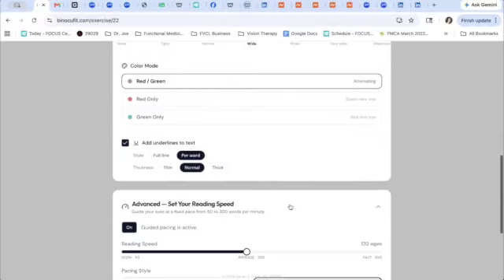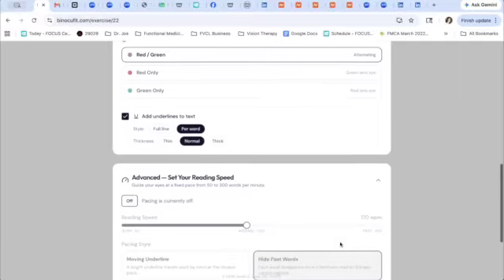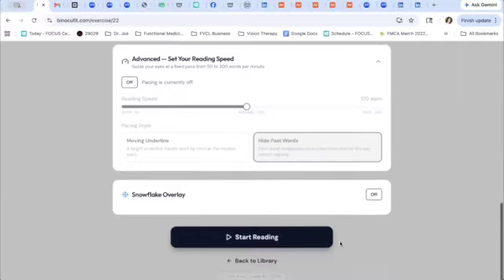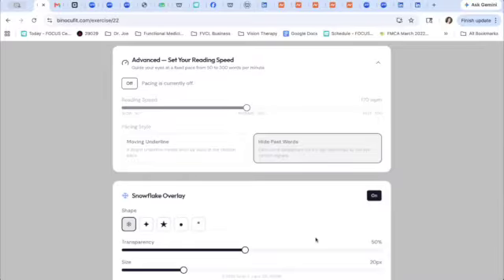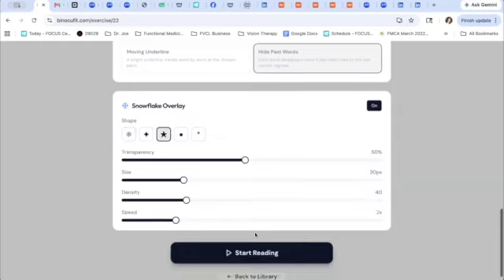So depending on the patient, you can turn those on, you can turn those off. They can challenge themselves to figure out what words per minute they'd like to push themselves towards. And again, we have the snow options. And in the reading, we have the option to change the shape of the snow, and the speed of the snow, and all kinds of things.